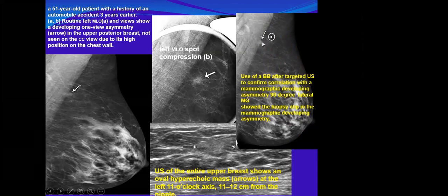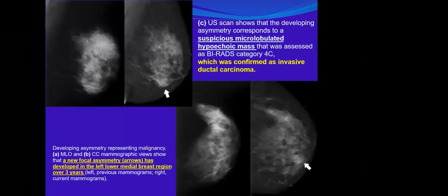Yes, they had done biopsy. You see, this contained the biopsy clip, and this is the BB. It confirmed that the biopsy was taken under ultrasound, and they put the clip to make sure the biopsy was taken from the same asymmetric finding. So, ultrasound-guided biopsy revealed fat necrosis.